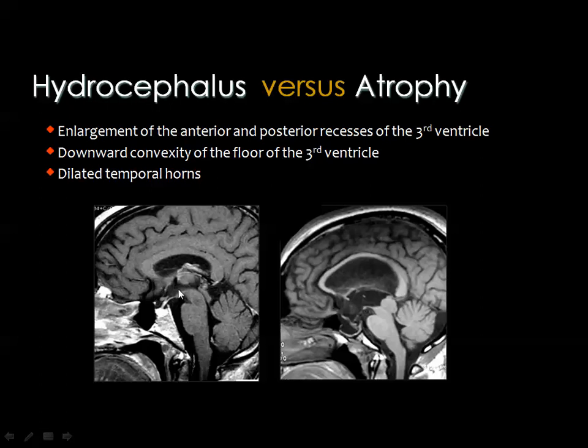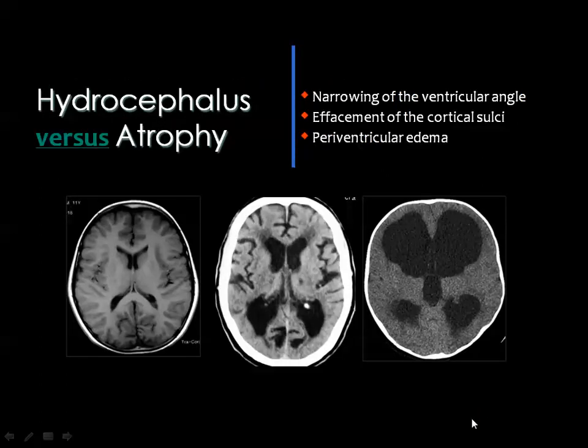And this is the third ventricle, and there are two recesses. The first one is related to the pituitary stalk and is known as the infundibular recess, and the second one is a little bit anterior, related to the optic tract, and this is known as the optic recess. Whenever the pressure increases in the third ventricle, there is marked dilatation of the recesses of the third ventricle. There are some angles, but they are no longer used after the marked development in CT and MRI.